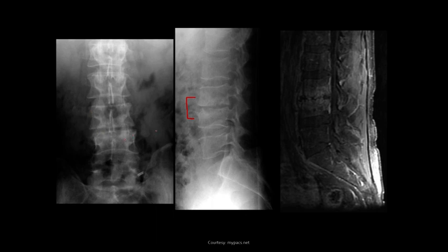in that region. The follow-up MRI, this is a T1 post-contrast. So the marrow is dark because it's fat suppressed as well. I guess I should write that. So T1 fat suppressed post-contrast. And the area where we can see this kind of increased signal is the infectious change. So this kind of region in here.